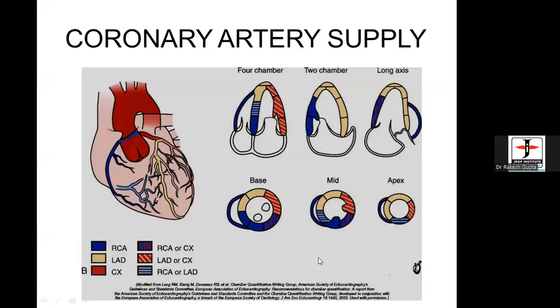Look, this is the most confusing thing in short axis. That's why we do not put more emphasis on short axis as of today. We are not going to look at short axis. Why? I'll tell you a reason first. The majority of our fibers are longitudinal fibers, which are depicted in 4-chamber, 3-chamber and 2-chamber views. About 70% are longitudinal fibers. 30% are radial and circumferential fibers, right?